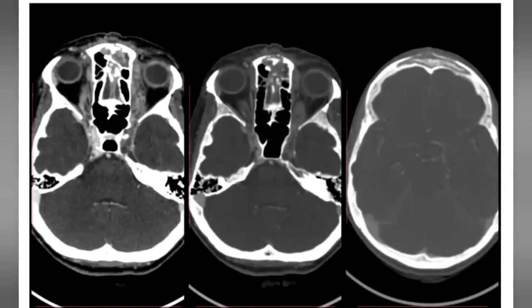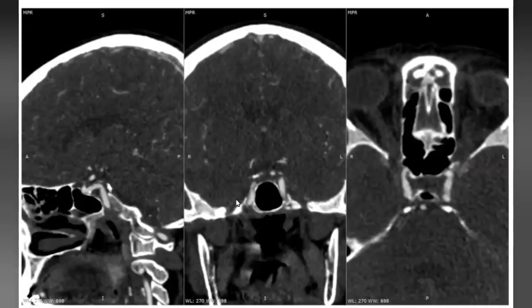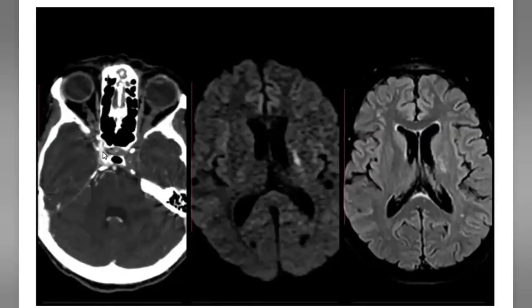Yes, sir, these are the initial images of this patient. I have a couple of serial studies of this patient. This is an old patient of mine. So here you can see the artery was there, both sides they were present. This is the arterial phase, and then in this case, the artery disappeared. You can see the cavernous ICA as well, but on the left side it's gone.